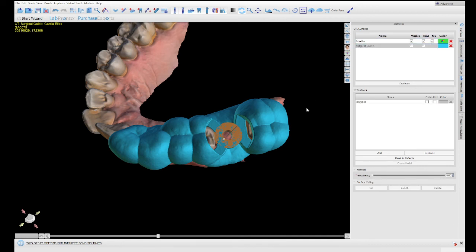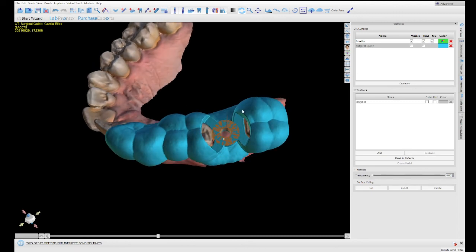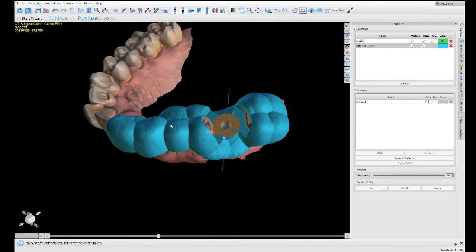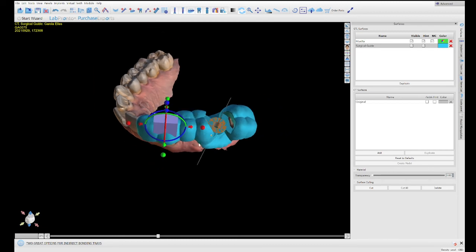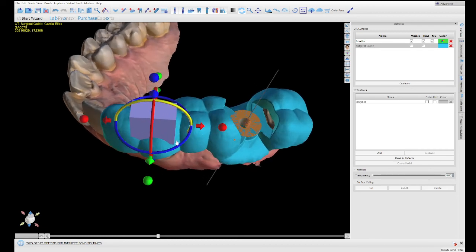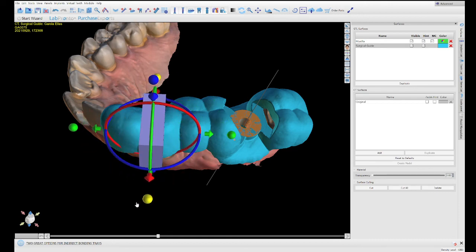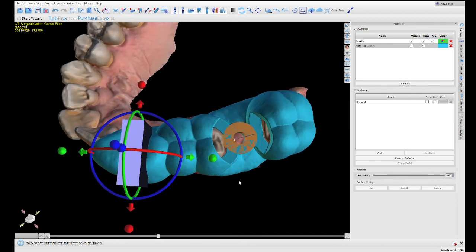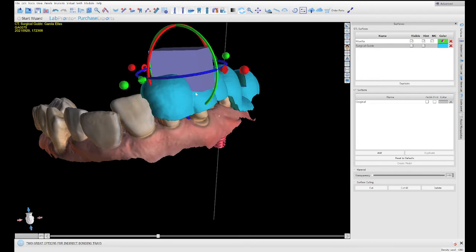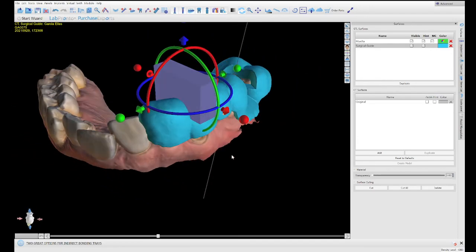Now I'm going to open another window right here on the front just for the exercise to make sure. See how it opens enough for your handpiece to go down? And now I'm going to open another window that is right here. I'm going to right click at a window and you start, this is going to be the outline of your window. So you determine how wide, how long, and what level you want that window. So I'm going to leave it there. I want to leave enough support for the surgical guide not to break. Okay, I'm going to leave it there.